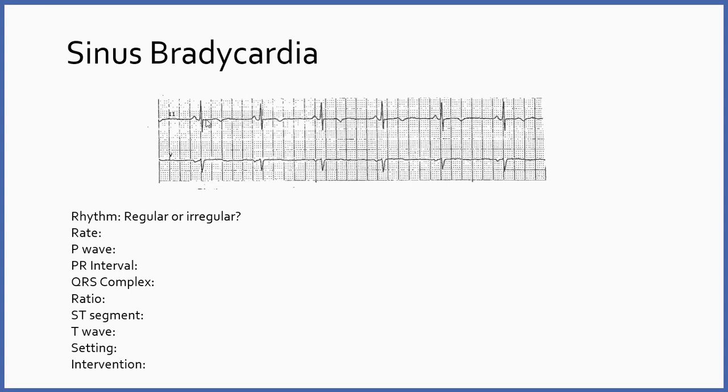Next thing we're going to do is look at the QRS waveforms. Now, I did identify to you that they really shouldn't look this way, but they do. The V lead should be like this. The QRS should be upside down like that. Then we measure the QRS, from the beginning of the QRS, this point right here. Do you see how it just rises from that baseline to the end? And that's this point right here. This point is something called the J point. It's the end of the QRS and the beginning of my ST segment. If I measure across, I got 2 baby boxes. Hopefully you did too. Now that's a normal range.